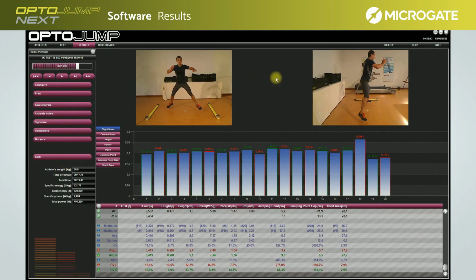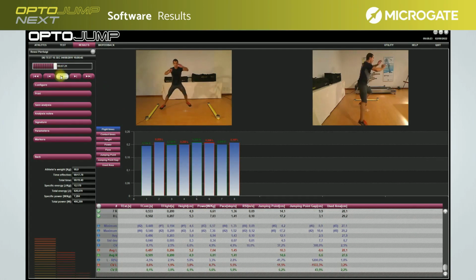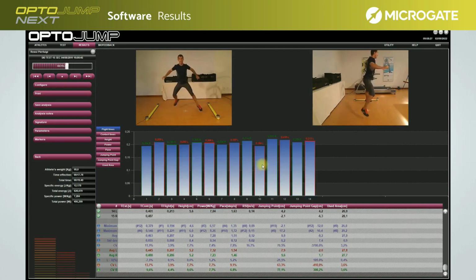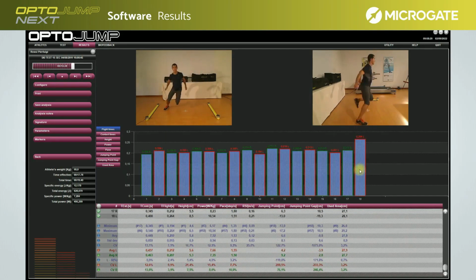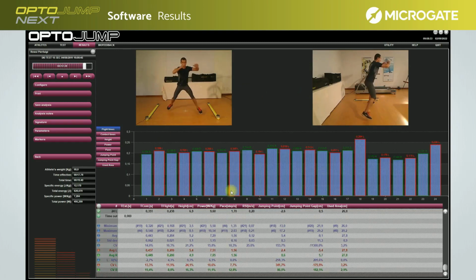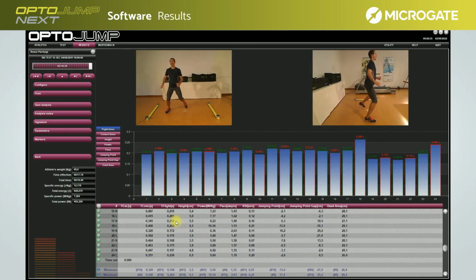In the central screen, we find at the top the window for viewing the test through a video recording. This type of video support is of great help to the user in the immediate detection of postural or motor problems, and more generally, in the qualitative analysis of the patient's movement. Thanks to the video memory, any abnormalities in the numerical data can be easily identified and explained.